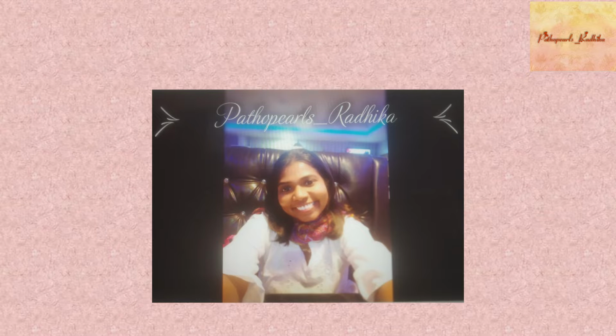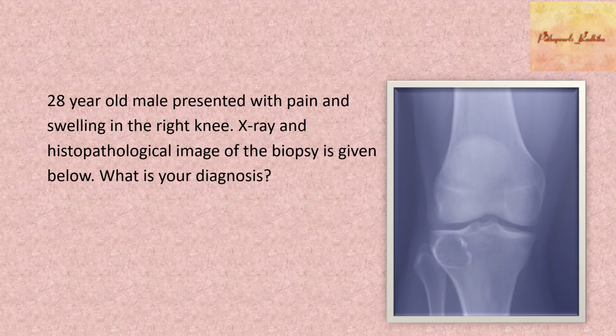So today we have a clinical scenario based discussion. The history is a 28-year-old male presented with pain and swelling in the right knee. X-ray and histopathological image of the biopsy is given below. What is your diagnosis? And here we have an X-ray. Are you able to find the lesion here?